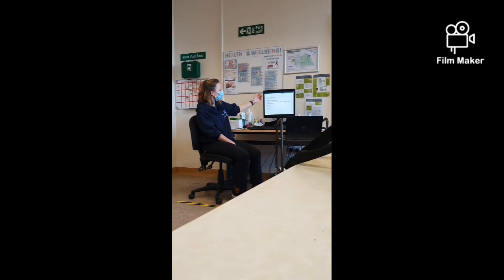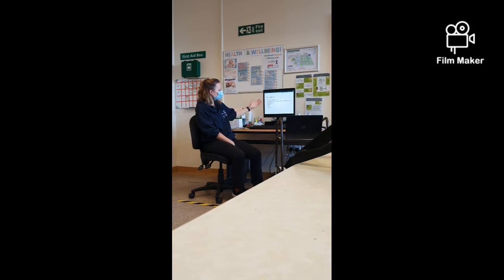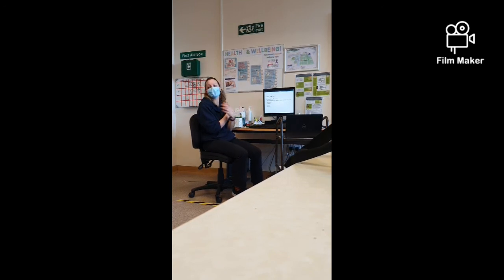Other things to think about when we're looking at chest X-rays is surgical emphysema, which is air under the skin. Pneumonectomies if they've had a lung removed, or a lobectomy if they've had a lobe of the lung removed. Rib fractures, so always looking at the ribs and following the path of the ribs.